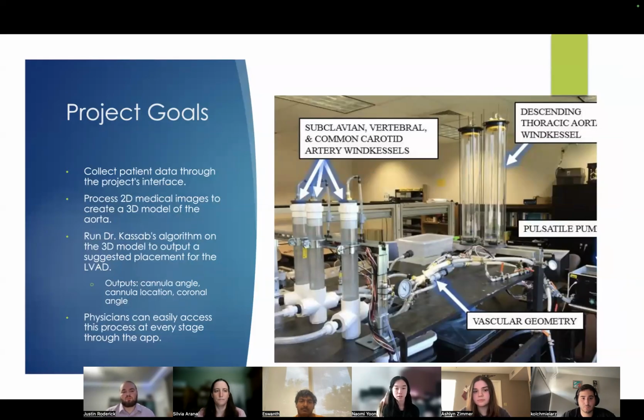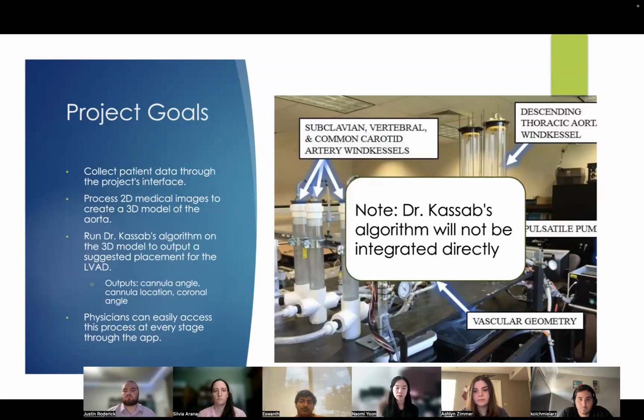So these were the project goals. First, we wanted to collect a patient's data through the project's interface. Then we would process the 2D medical images to generate a 3D model of that aorta. Then we would take the final model that we generate and run it through Dr. Kasab's algorithm to output a suggested placement for that LVAD. And of course, the overall goal was for physicians to easily access this process at every stage. And just as a quick note, we were not able to gain the proper clearance to directly access Dr. Kasab's algorithm, so it will not be integrated directly into the project.